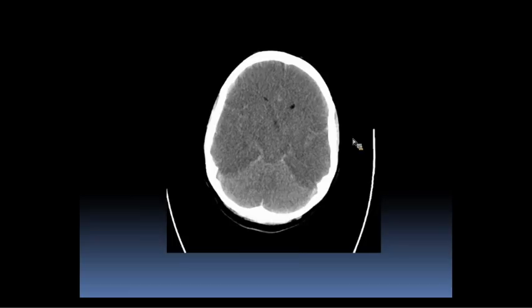So this is the last case that I'm going to show, and which side is the abnormality on here? So it's getting some smiles. It's obviously a very diffuse abnormality. So this is a very unfortunate situation here. You have complete loss of gray-white matter differentiation, hypodensity involving the entire supratentorial brain, no sulci, no ventricles, really no basilar cistern here as well. And then what we have is preservation of the cerebellum, right?